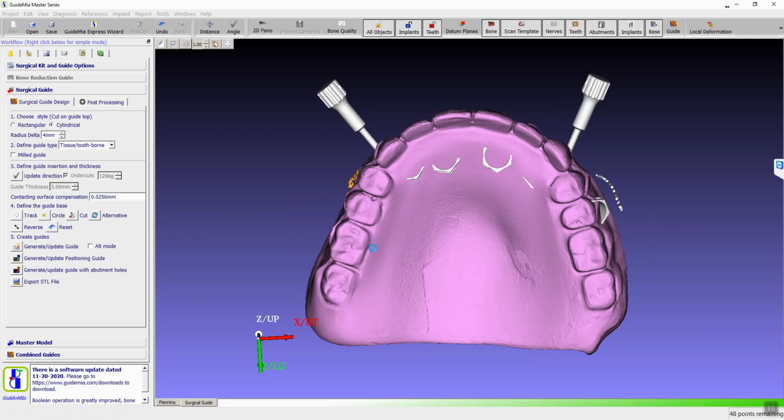Hole, and then you can remix this because it's a digital design, got good model quality. I'm not sure why it's flashing this progress bar here. It should be finished already. Maybe it's too many implants. That's the only thing I can blame.